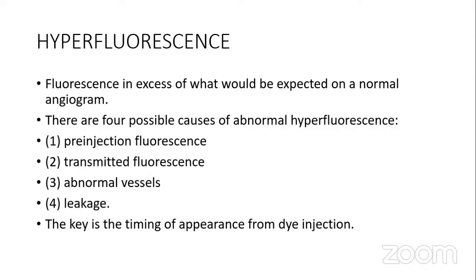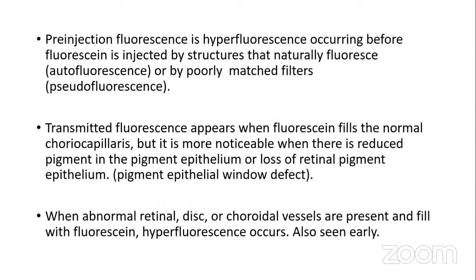So these are the possibilities. Now, for the pre-injection, dye is not yet in the circulation, but your pre-injection angiographic shot gives a hyperfluorescence. So there are two possibilities.